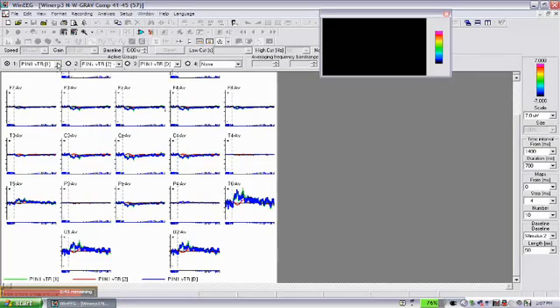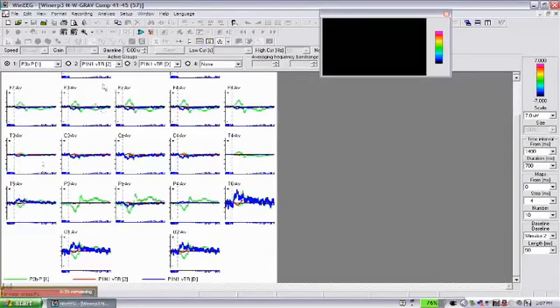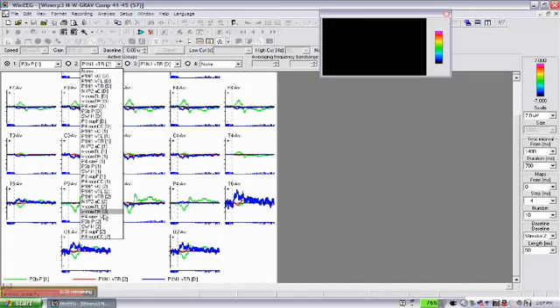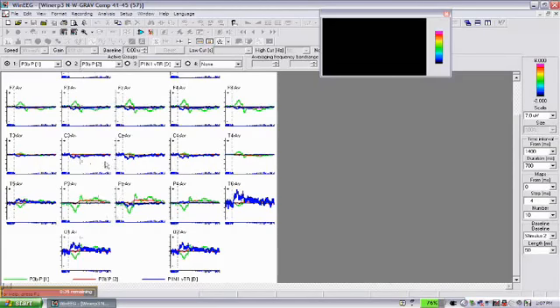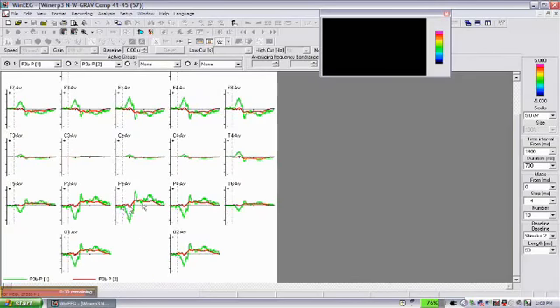the left temporal area. Then we can check the P3B component in this patient and compare the P3B component with the database. We actually don't see any differences in this patient except this negative part, but it goes quite early.